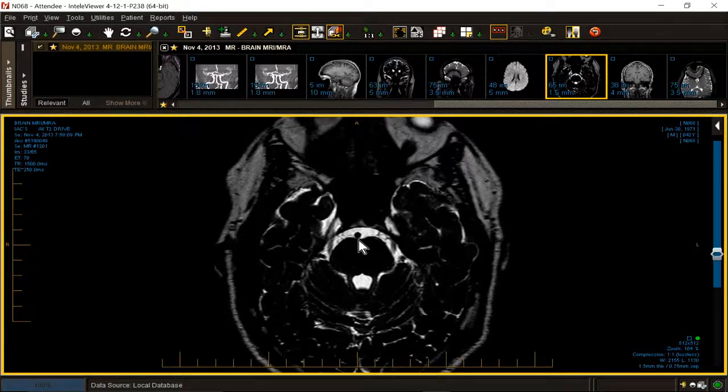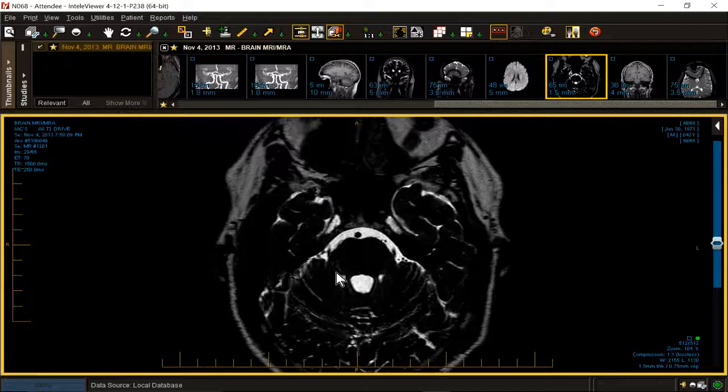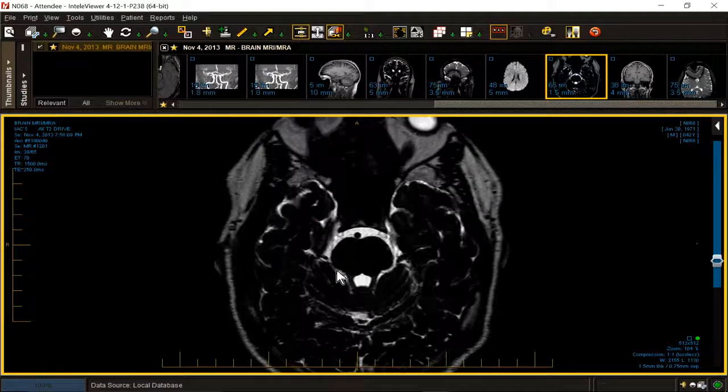Our right sixth nerve is probably right here at the apparent exit. The real origin of the sixth nerve is over here. The real origin of the facial colliculus, bump, and facial nucleus is here. Brachium conjunctivum, middle cerebellar peduncle, just to occupy you while you're looking.